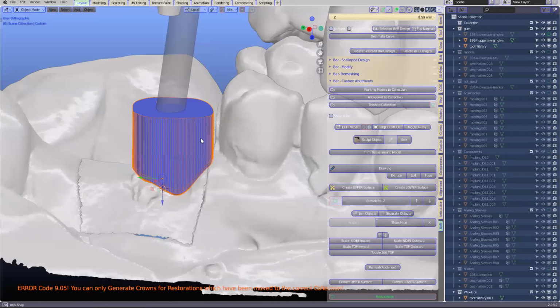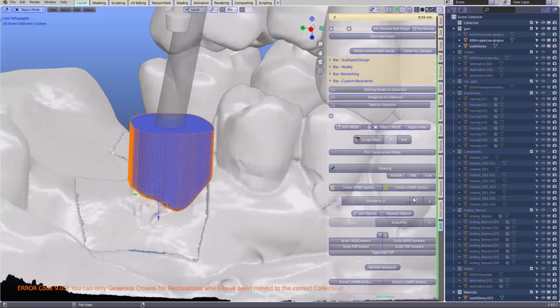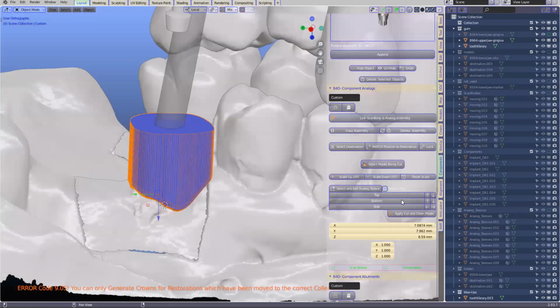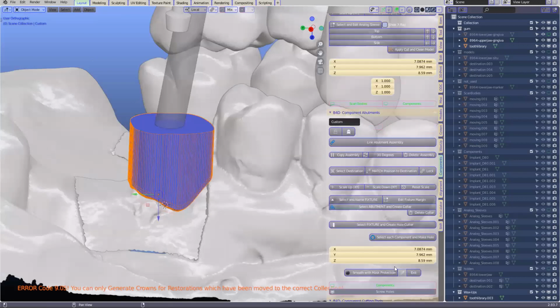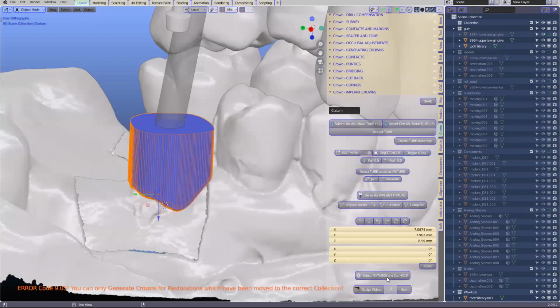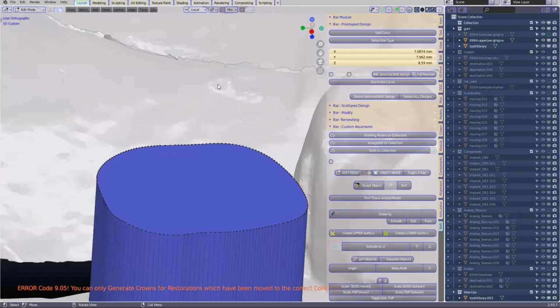Actually, what I'm going to do is just hide the screw holes. So I'm going to flip over to the component module, and if I can just take in the crown module, and just take the screw hole and hide those. Yeah, screw holes, hide them. Okay, now what we're going to do is this is all 90 degrees, and we're going to create a measurement if you want to angle it. So I'm going to follow this line.